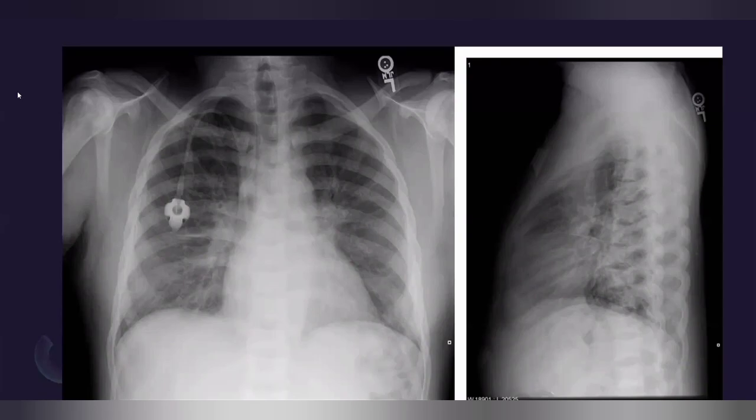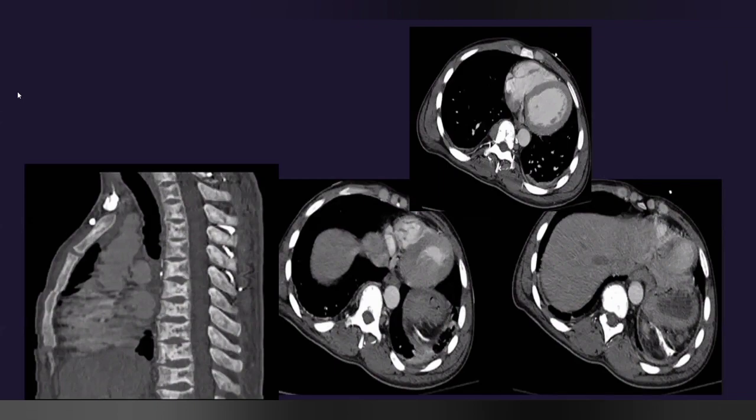Excellent, excellent. So this is sickle cell disease, and in the lung there is some coarsening of the interstitial markings, and this is acute chest syndrome. These patients can present with acute bone crisis or acute chest syndrome, presenting with acute exacerbation of vaso-occlusive disease anywhere in the body, mostly in the bones or in the chest. So this is the same case. What additional findings do you see here?